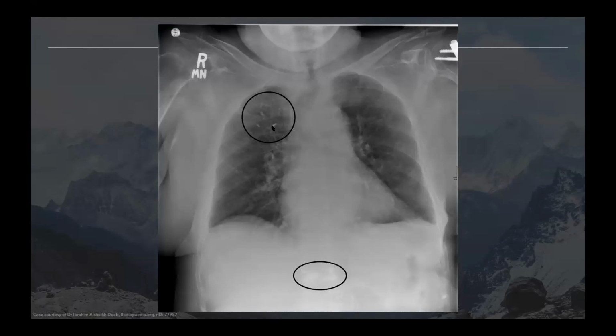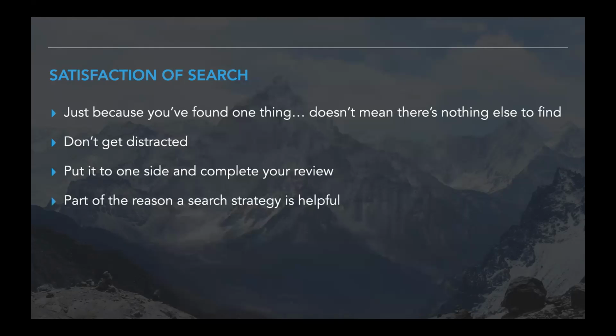So it's effectively the same thing as pulmonary emboli in terms of its clinical impact, but there is no way of treating this. You can't anticoagulate because it's not thrombus. It just sits there, and that's game over for that little bit of lung that's supplied by these arteries. So this is known as vertebroplasty cement embolization. Again, very unusual, but worth knowing that it can happen.